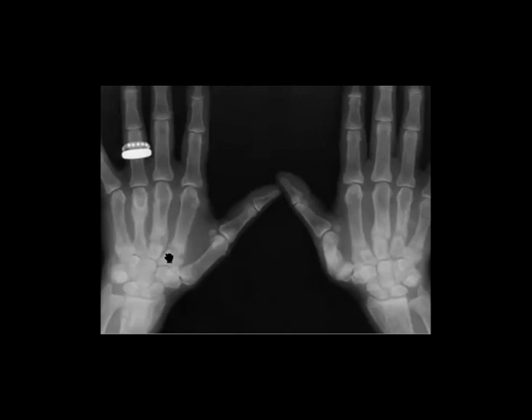If you have an oral exam, they will ask you about the common sites, and probably they will show you some images of the common sites. So what are the common sites of the Looser zones? Yeah, the pubic rami, inferior pubic ramus, medial femoral neck. So inferior pubic rami, the proximal femur, the medial, and I see the scapula.